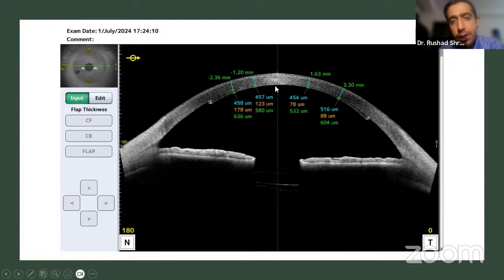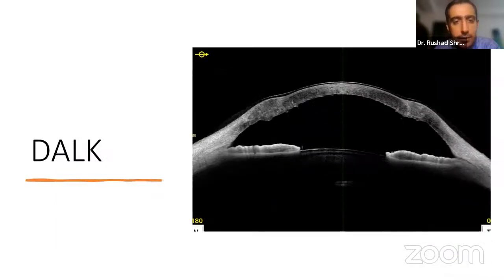This is used to treat patients who have, say, pseudophakic bullous keratopathy after a cataract surgery, or who have Fuchs endothelial dystrophy along with cataract, when you perform a triple procedure and you do a cataract plus a corneal endothelial transplant. So DSEK is one of the procedures along with DMEK, which is Descemet's membrane endothelial keratoplasty, which can be monitored very well with an anterior segment OCT. I'll show you an example also later where the DSEK graft is not attached well.